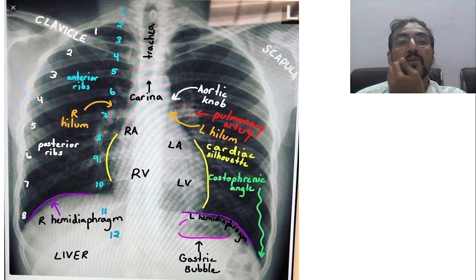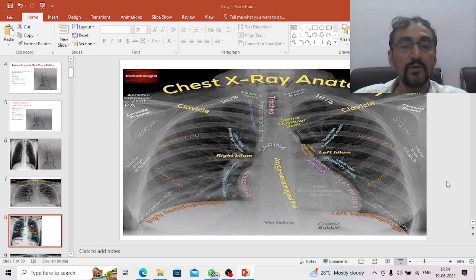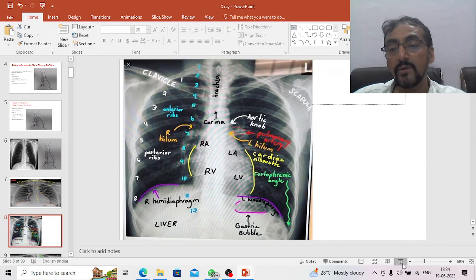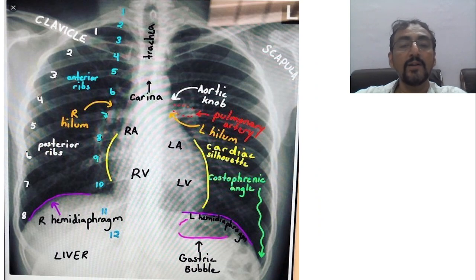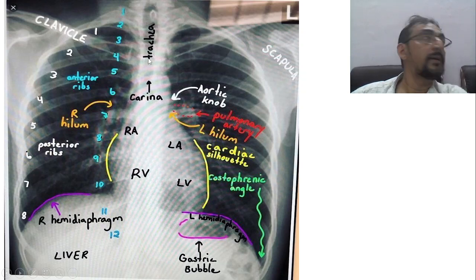Okay, so for the same better understanding, now we have got another important picture. So this will make you understand और अच्छे से आपको पता चलेगा. See, this is the area of the trachea. ओके, ट्रेकिया. सो ट्रेकिया सेंट्रली है या नहीं हमें देखना है. दिस इज द एरिया ऑफ ट्रेकिया एंड दिस इज द एरिया ऑफ क्लैविकल. ओके, दिस इज क्लैविकल सीन ओवर हियर.